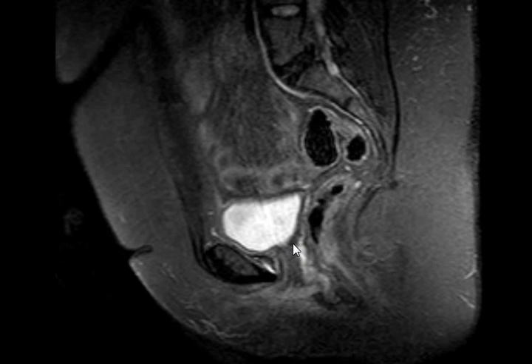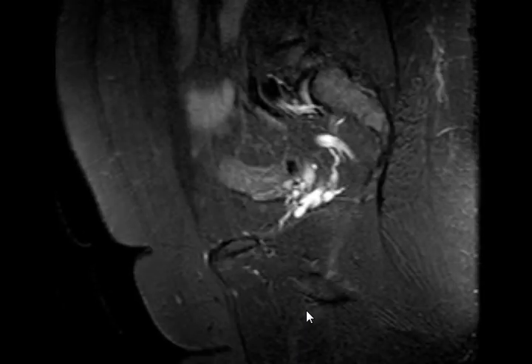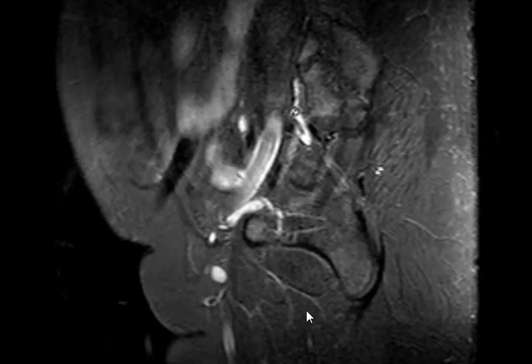We should look at the kidneys. Exactly, because whenever there is a genital abnormality, you look for renal abnormality as part of what's called, what's the syndrome? Meyer-Rokitansky-Küster-Hauser syndrome, which involves urogenital anomalies. What other abnormalities are present here? Congenital anomalies don't happen alone. Usually they are multiple.